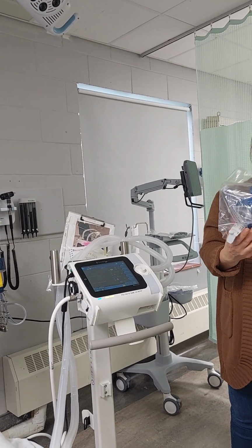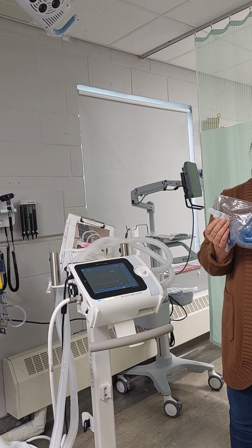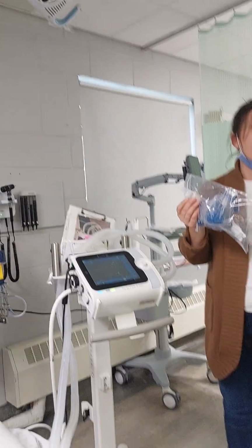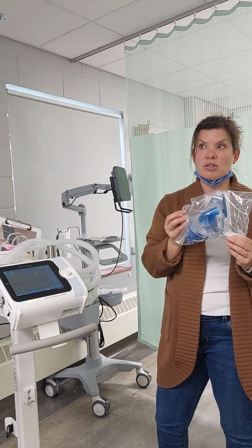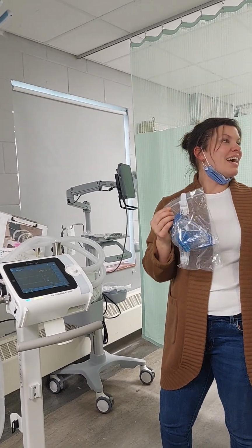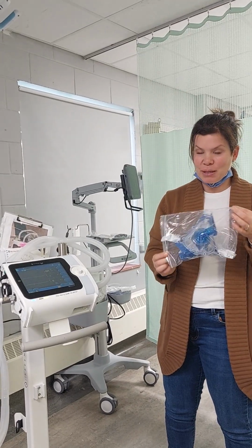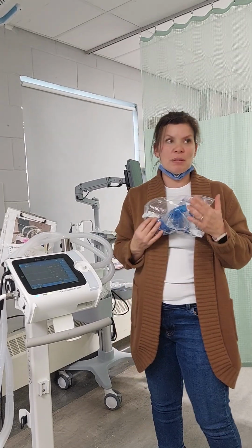I think what we'll have to do is, because I think I still special order these, and if Jason needs them, he just comes and takes them, which is fine, because we don't actually use these very much. I think I've used two this year so far in Blind River. Oftentimes we don't use it that much, so that's why people do forget about them.